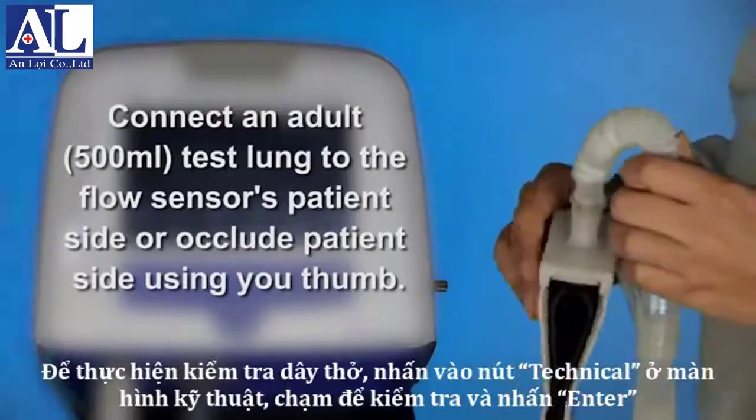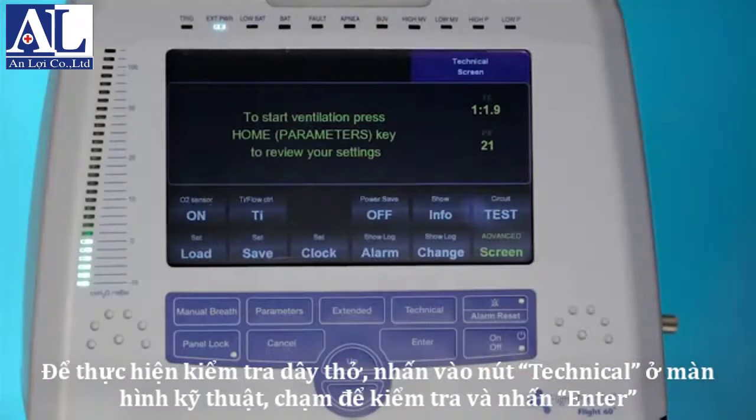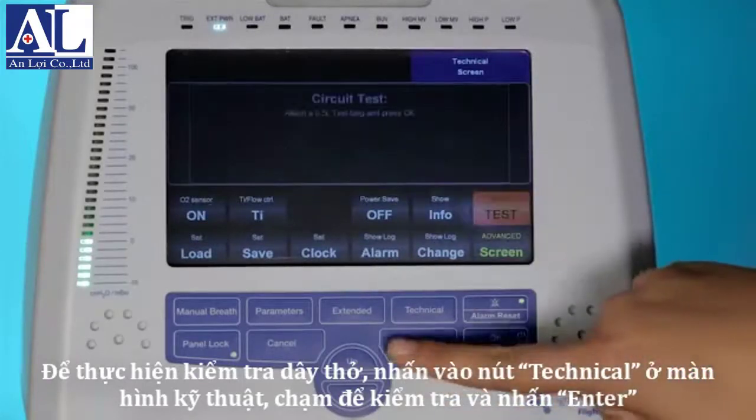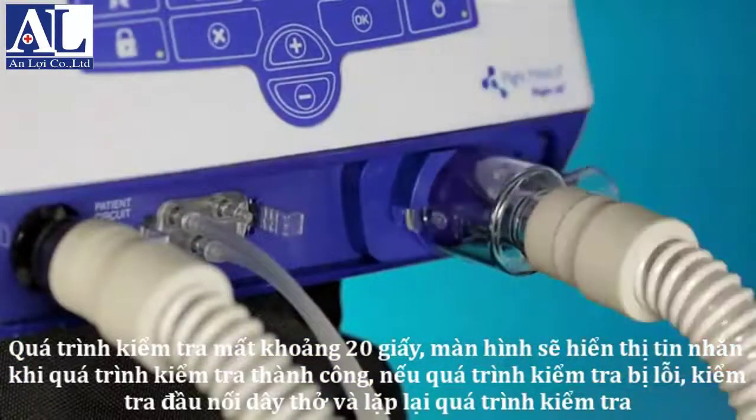To perform a circuit test, press the technical button to enter the technical screen, tap the circuit test button, and press Enter. The test takes about 20 seconds. A confirmation message indicates a successful test. If the test fails, check the patient circuit connections for possible leaks and repeat the test.